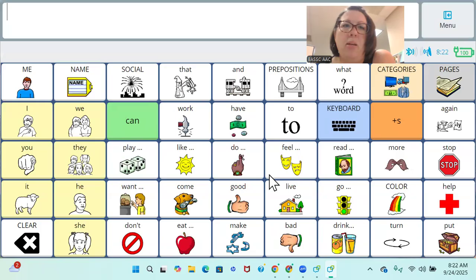All right. One other key feature that you need to be aware of is that if you've had NuVoice software in the past, you are able to write with icons. This emulator will not allow you to do that. So it will act just like the device, so that you can provide aided language input, you can modify a vocabulary and easily transfer it onto a student's device, but you will not be able to write with icons. You can still use the snipping tool from Windows if you're on a PC computer.